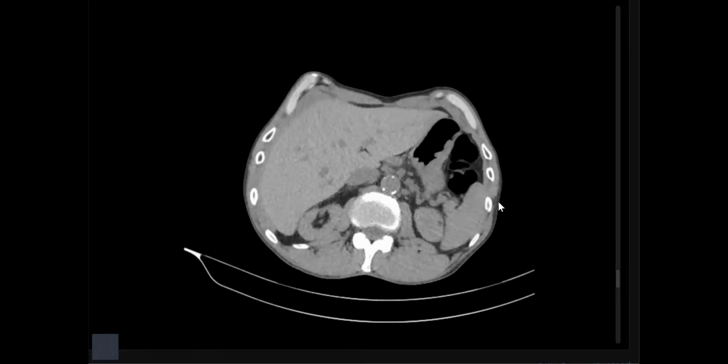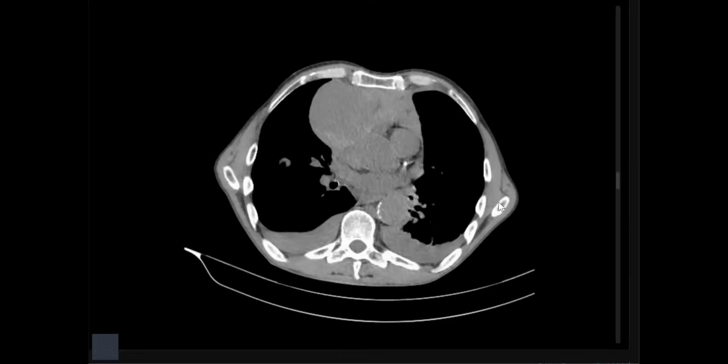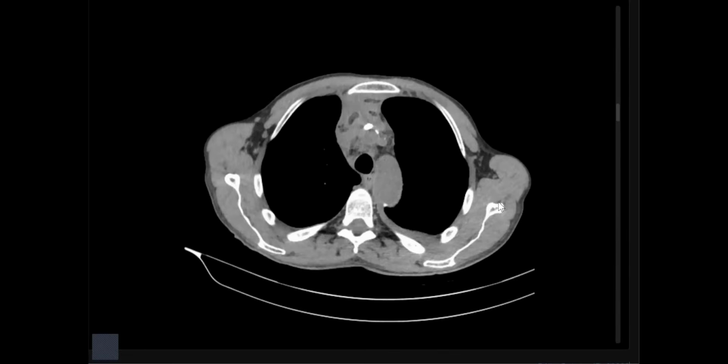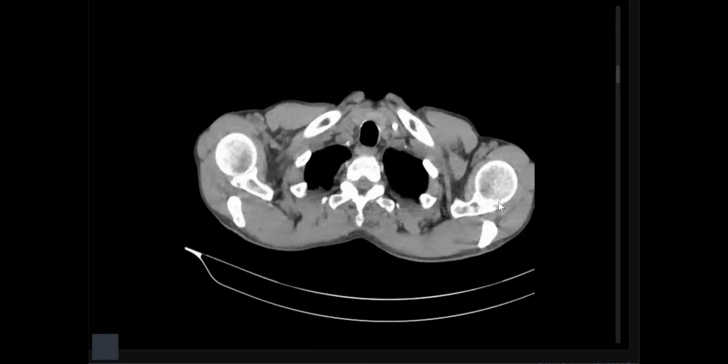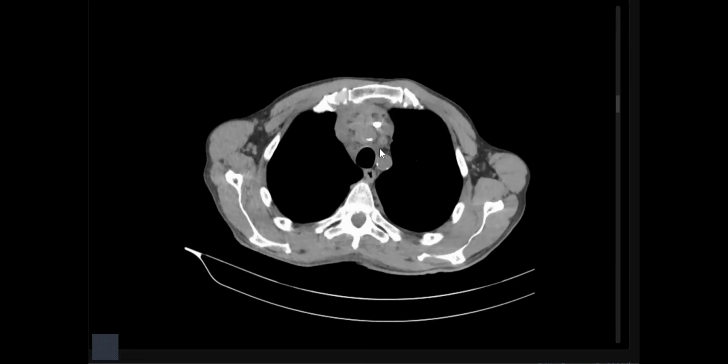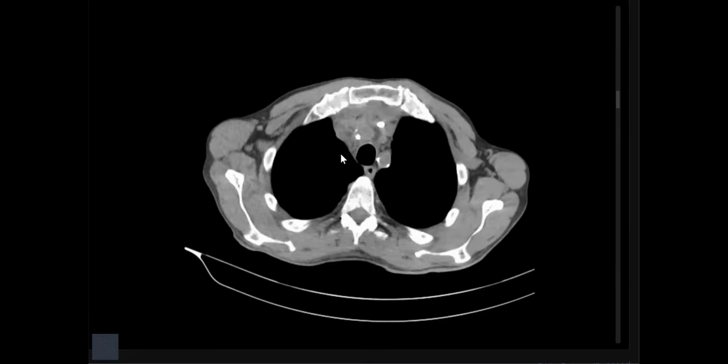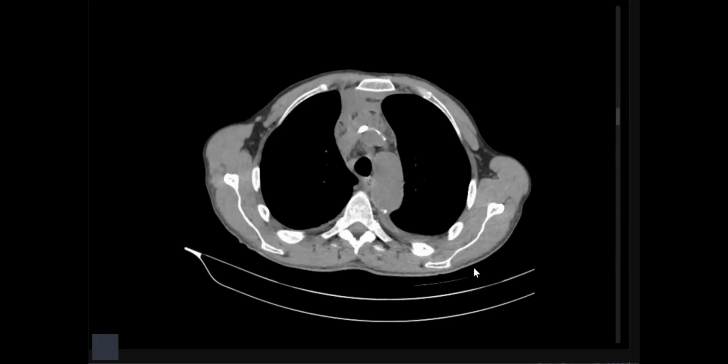I would be concerned about the dialysis catheter tip, whether it is extending beyond the confines of the vessel. Over here, it is not extending into the vessel; it is outside. So maybe it has pierced some vessel, which has resulted in a mediastinal hematoma. I would confirm with post-contrast studies. Okay, I'll give you now the contrast study.